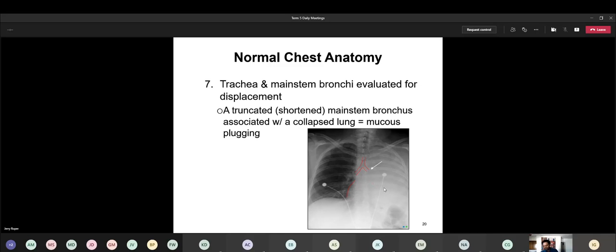And then once again, with all this white, where is the border of the left side of the heart? Can't see it at all. It all ends up getting blurred together.